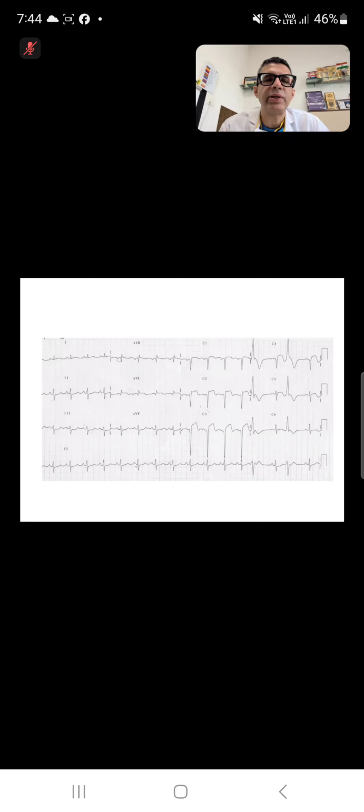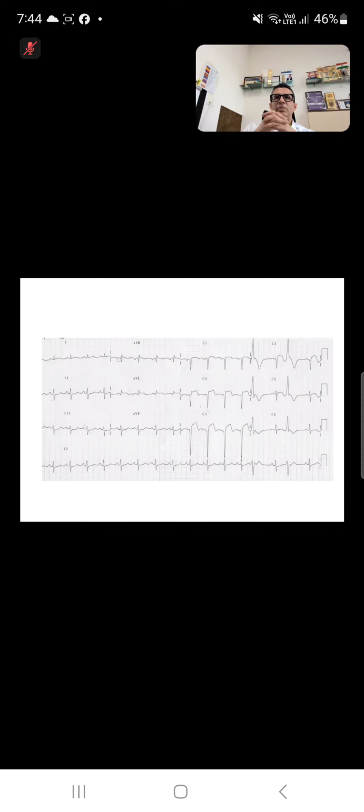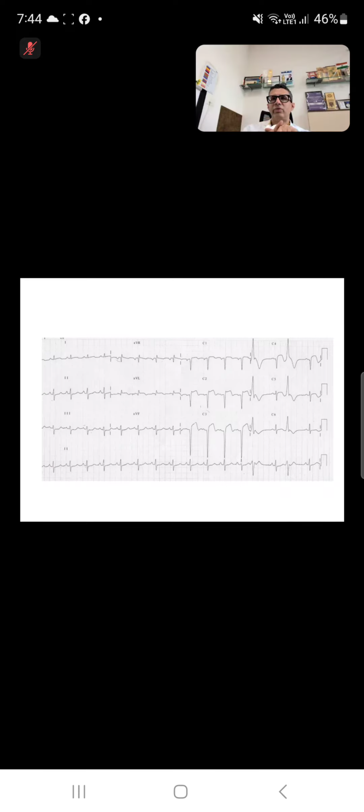0.32. Then we are just calculating to see whether it's really prolonged or not. So now this is 5, 10, 15. 15 into 0.04 is 0.6. Square root of 0.6 will be about 0.8; 0.8 squared is 0.64, so slightly less than that, probably around 0.77. So 0.32 divided by 0.8 will come to around 400 milliseconds. If it comes down, then it will be around 420, 440 milliseconds.